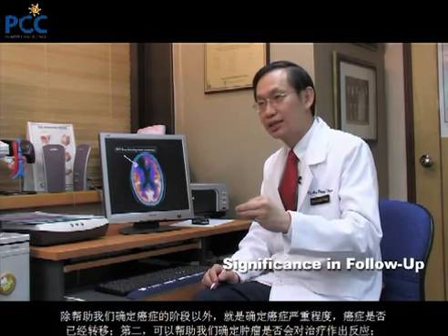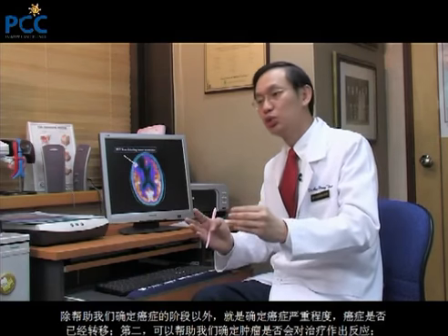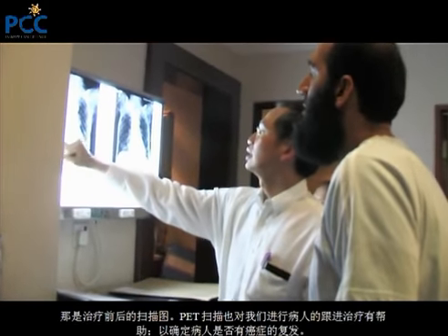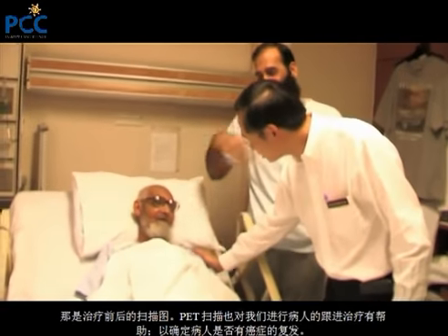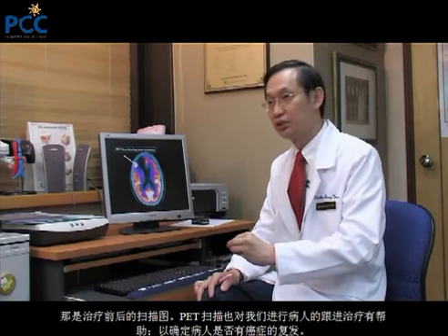Besides helping us in staging the cancer, meaning what stage it is, whether it's metastasized or not, and number two, in terms of helping us determine whether the tumor is responding to treatment, that is a before and after pictures, the PET scan is also useful in helping us to follow up a patient, to determine whether a patient has or does not have a cancer recurrence.